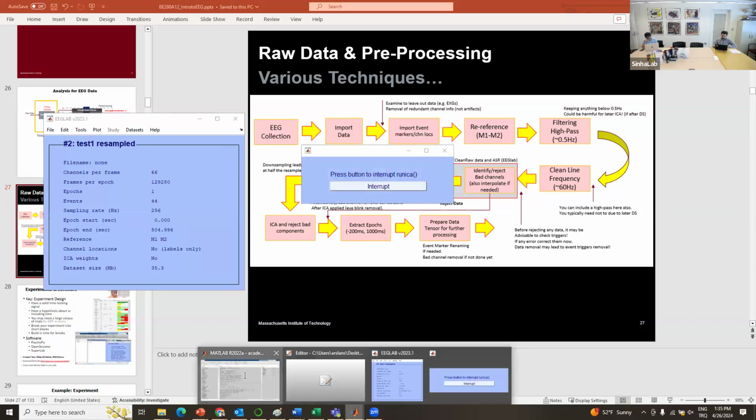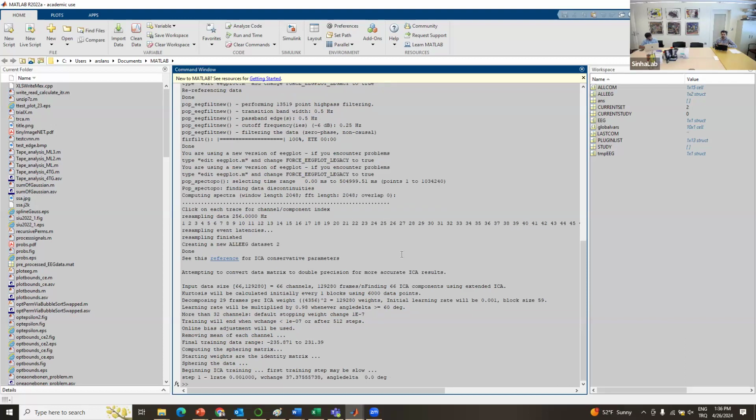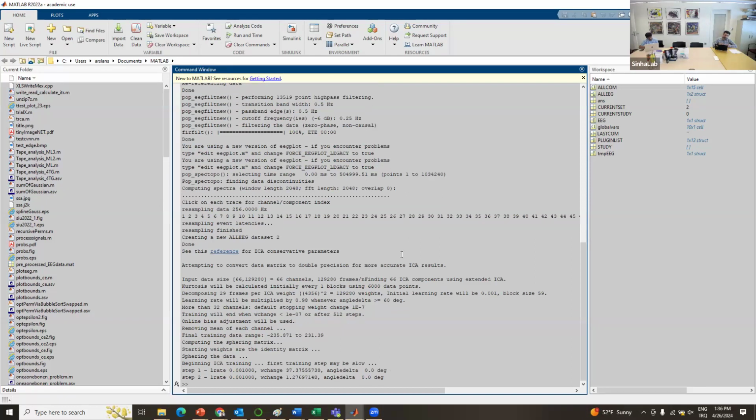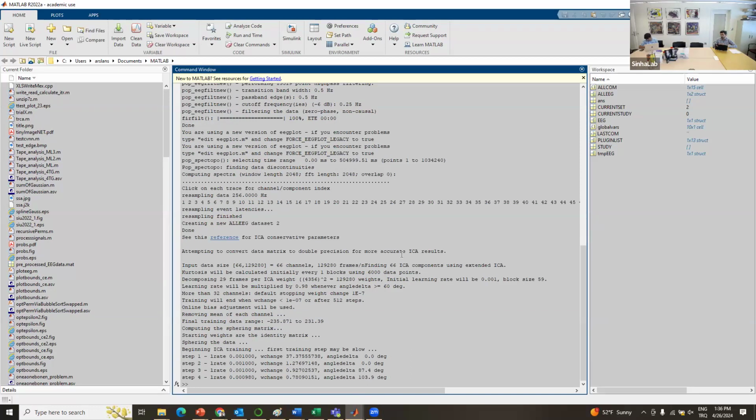So you can see that the ICA takes time. It's going to run a lot of iterations because, as I said before, calculation of the mixing matrix and the sources is a challenging problem. You have to make assumptions, but those assumptions result in an implementation that does lots of approximations. Therefore, most of the ICA implementations are done in an iterative way, and an iteration is subject to a certain convergence criterion.